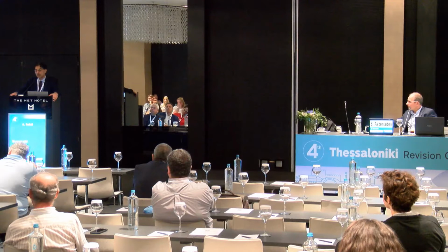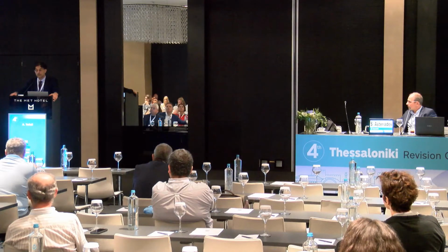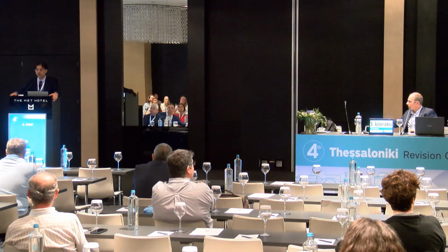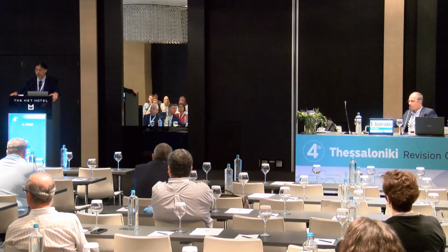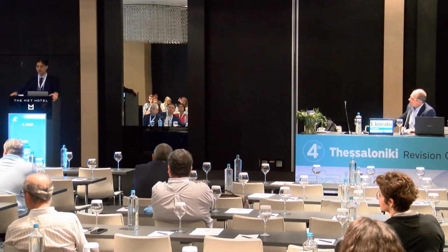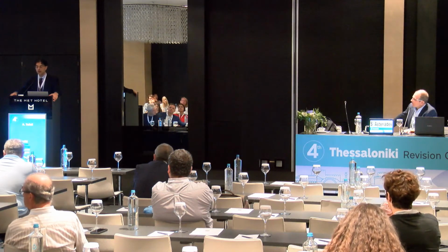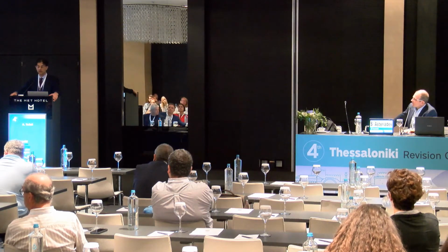The reason to do the ICG is you could then have the option of argon laser if the polyps are well extrafoveal. You can just argon laser them. If they're peripapillary, I've done that on lots of patients, and it works very well. If it's well extrafoveal, you can argon laser them, and that's cheap and accessible for all of us. If they're close to the fovea or subfoveal, you clearly can't.